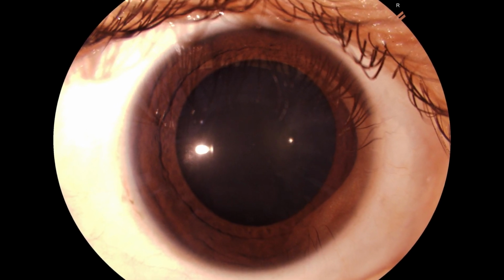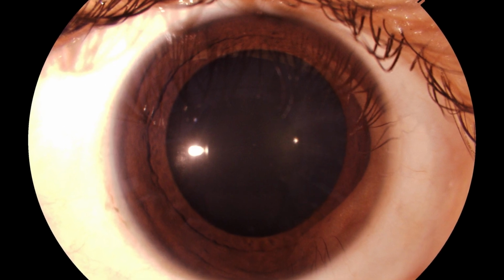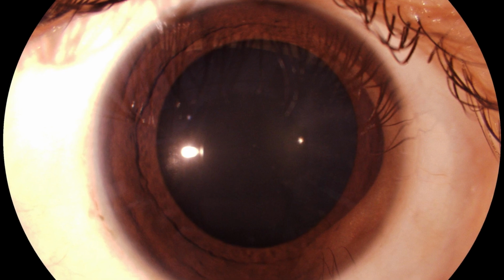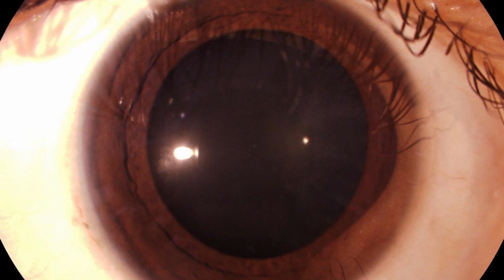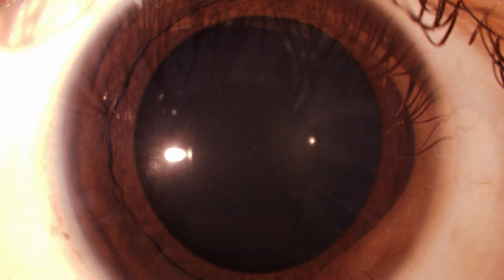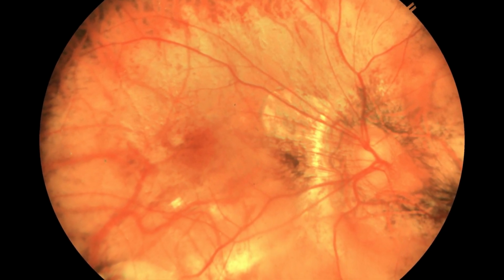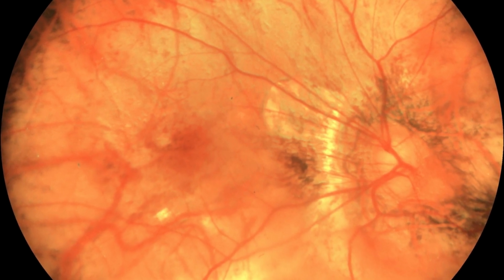This is one interesting case, and this will give us an insight about how refractive correction or refractive surgeries are useful for patients. This is one particular lady who had a refractive error of minus 23 diopters. This is the anterior segment photograph, and this is the posterior segment photograph of the right eye. And we can see that there's a staphyloma around the optic disc.